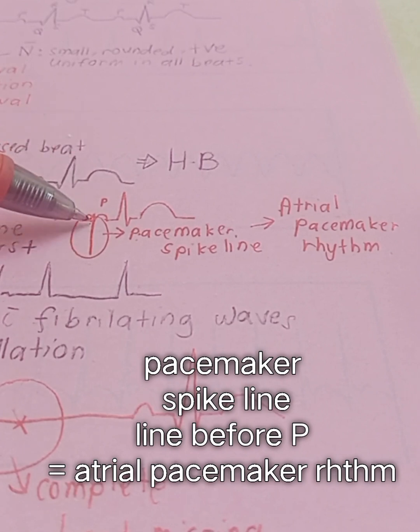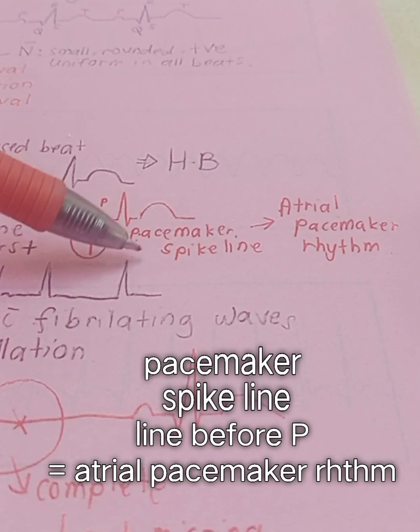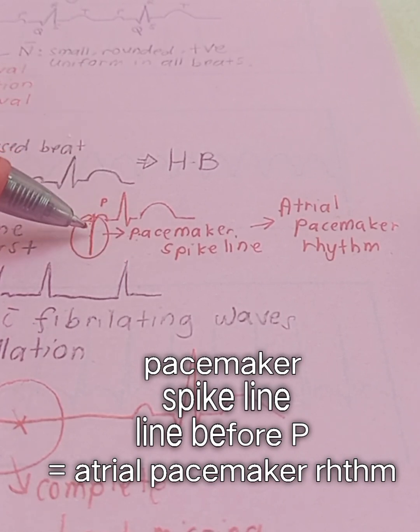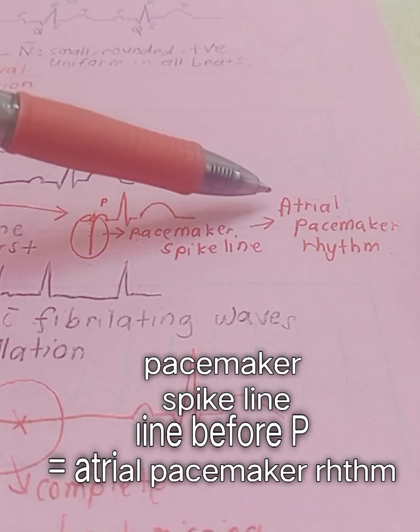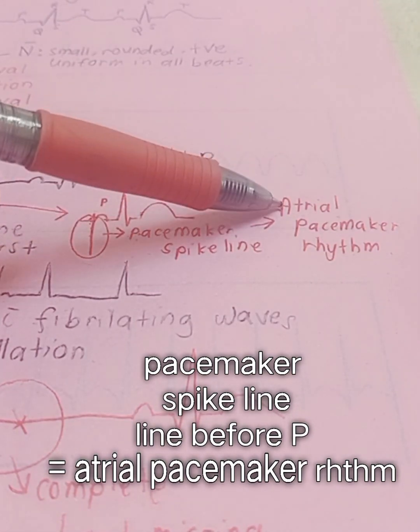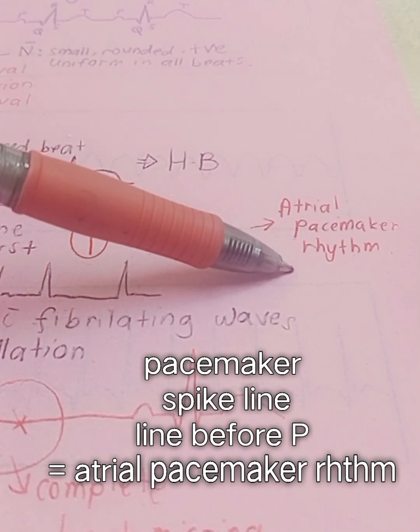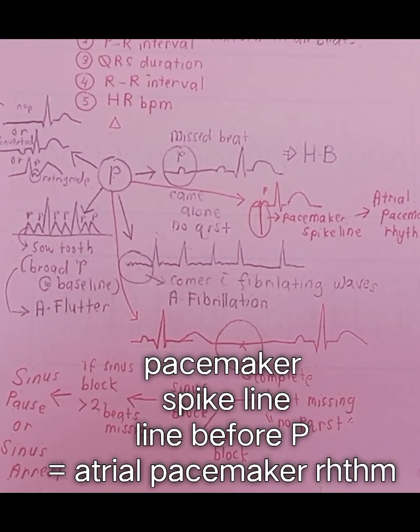If we see in the rhythm there is a spike line before the P wave, this is the pacemaker spike line. The patient has a pacemaker where the pacemaker lead is inserted in the atrium. So a spike line before the P is an atrial pacemaker rhythm. So this is all about P wave.